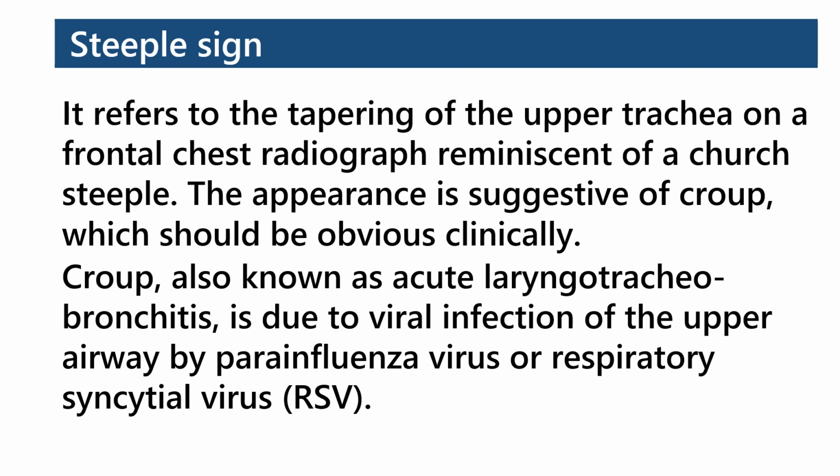Steeple sign refers to the tapering of the upper trachea on a frontal chest radiograph, reminiscent of a church steeple. The appearance is suggestive of croup, which should be obvious clinically. Croup, also known as acute laryngotracheobronchitis, is due to viral infection of the upper airway by parainfluenza virus or respiratory syncytial virus.